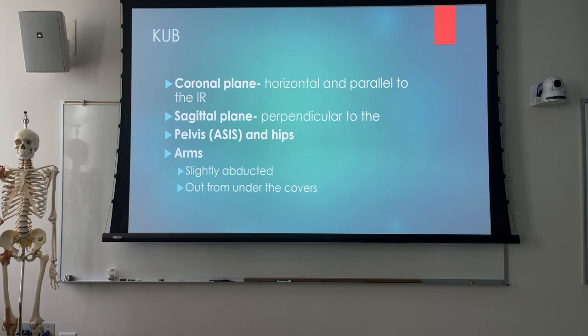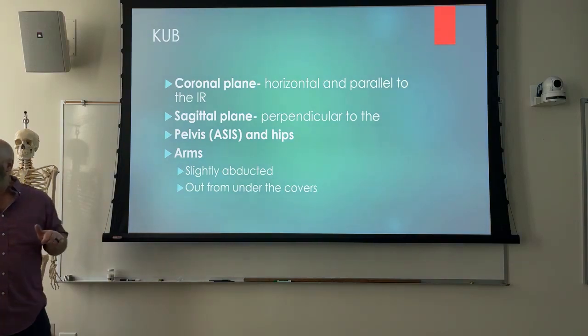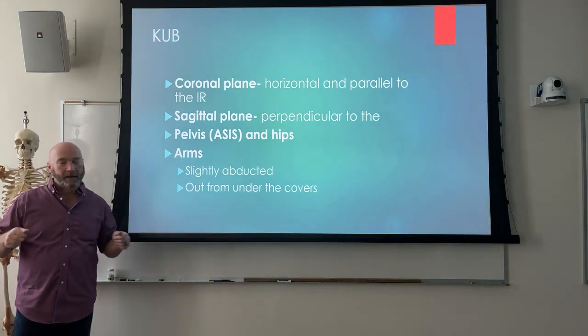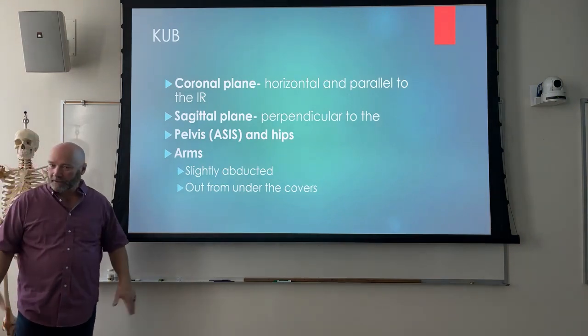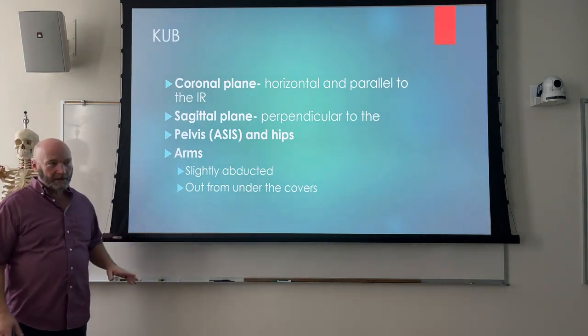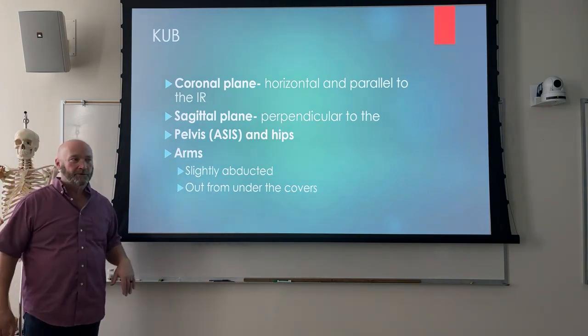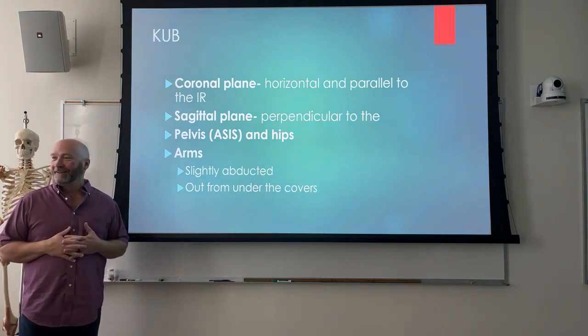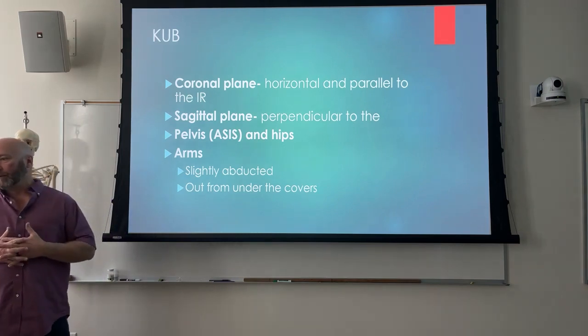Anybody seen this little situation going on? You got the little old lady who's cold, right? So you put a nice warm blanket on her straight out of the warmer, and she gets all cozy, and you get her positioned, get her arms down to her side, and then you step back behind the control panel, you make your exposure, and you have this. Anybody? If you haven't, you will. Sooner or later, it's going to happen, right?